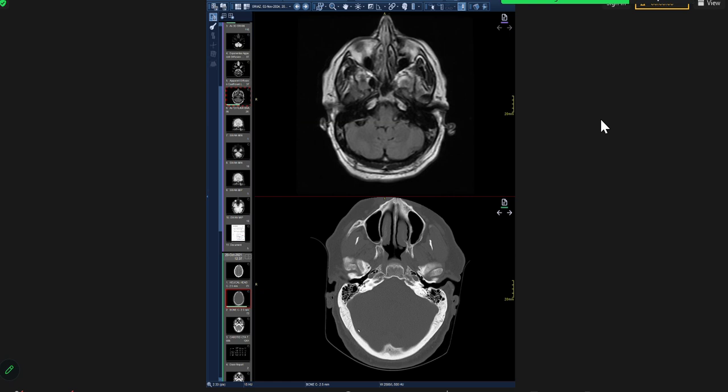Could this be a cause of dural sinus thrombosis? So then you look at the clues of it. Sometimes the clot in it, depending upon your hematocrit, looks different. Always remember that hemorrhage is very difficult at every stage. I've been practicing for more than 15 years and I still miss it. I'm just telling you. So it's not that you just have to be vigilant.